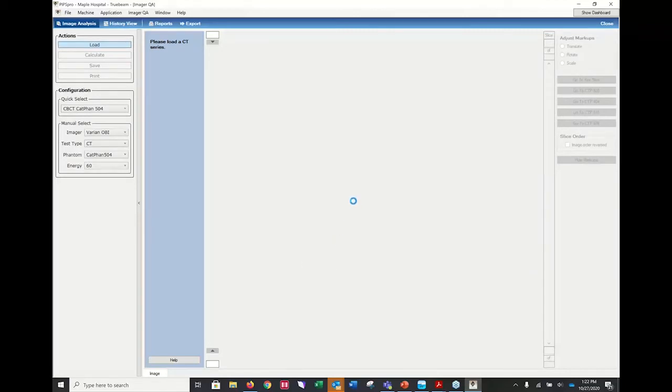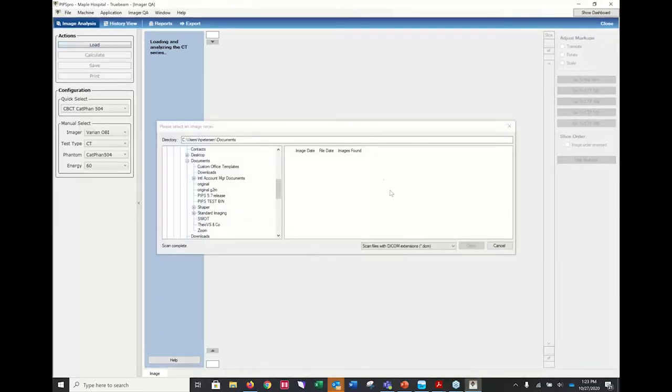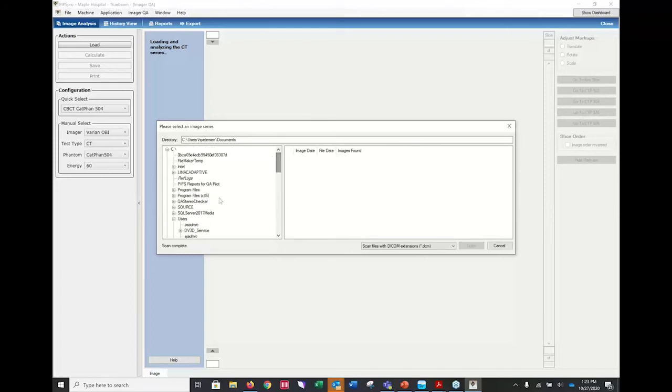Nice thing about the software, running a little slow today. My wife is working from home. Our server is a little slow today. Very slow today. There we go. Oh, that's why, because I did not set this test. So this is good, actually. I'll show you how to set a quick setup. Like I mentioned, it remembers where things are, but I have not done this one yet.